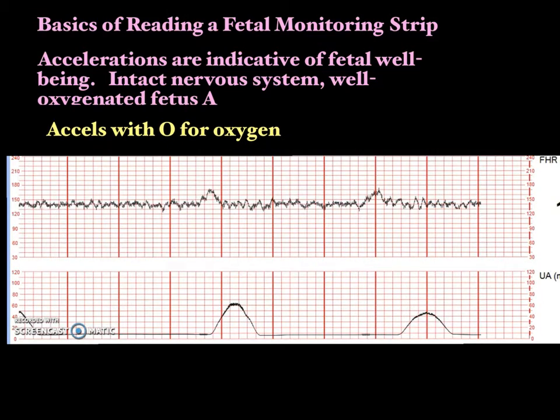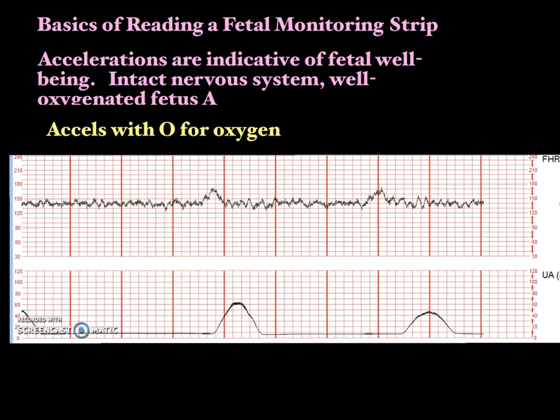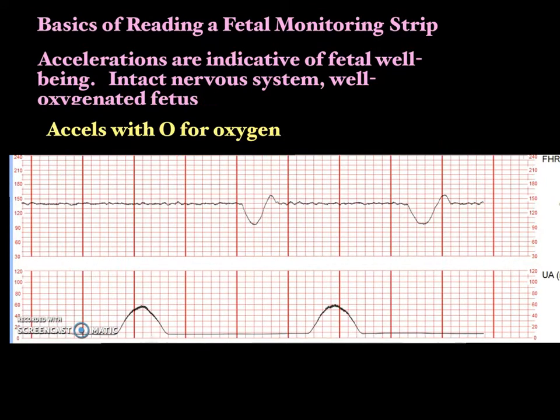But a moderate strip that has moderate variability with accelerations and contractions that are spaced adequately. This is a good strip. This is a day I'm going to have breakfast. I'm going to get my coffee. I can sort of relax and take care of this patient. Worry more about making sure mom's comfortable. I know I have a good, healthy baby. So this is a good strip to have.